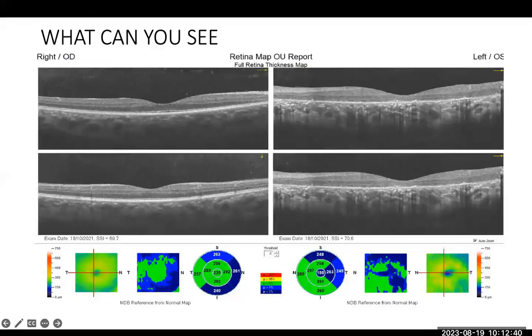Especially for the scan line that is from left to right. If you look at the topmost part of the picture, you see the scan line. The one pointing to the right, that's the upper one. The lower one is pointing down. That's the scan that comes from superior down to inferior. All right. I hope I've been able to satisfy that.